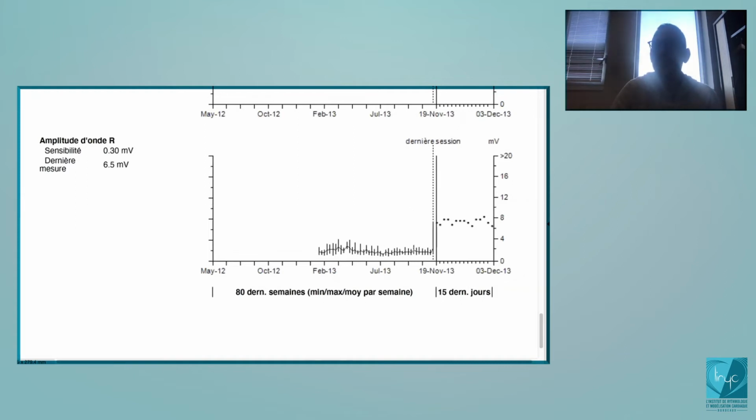And in this kind of situation, that's a huge problem because you're not sure that you will correctly detect an episode of VF, and you increase considerably the risk of any oversensing. And once you have modified the programming, you see now that you're working with a device with 8 millivolt of R wave. And in this patient, there was not anymore any problem of oversensing. And I think that in this situation, you increase considerably the chance to correctly detect an episode of VF.